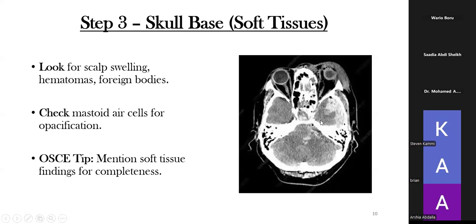I've seen patients who come with knives, where the knife tip is stuck somewhere here. We've had bullets that are stuck here, especially in the middle cranial fossa. A lot of people who view these scans, even at postgraduate level, even consultant level, sometimes tend to miss out.